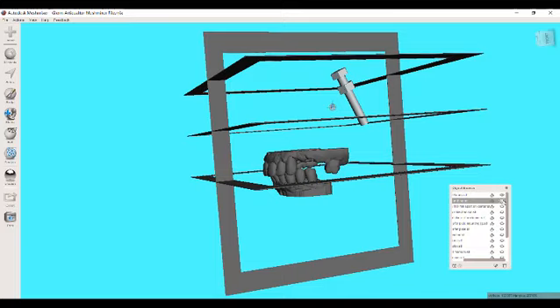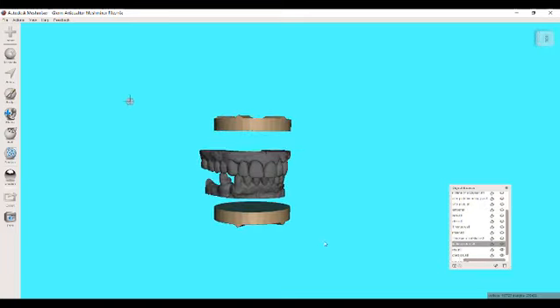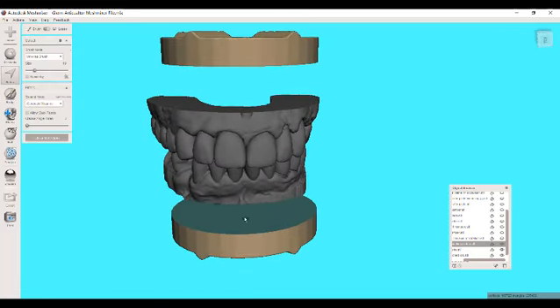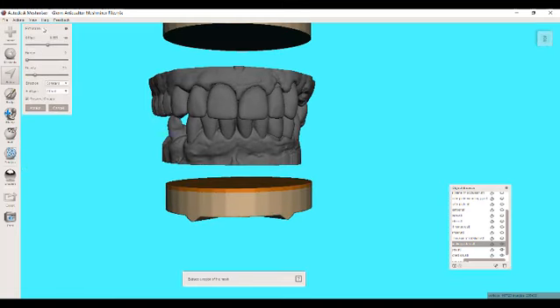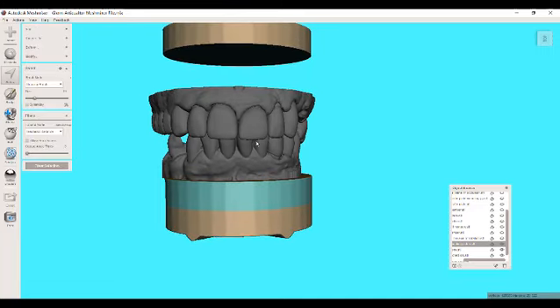So with that done, I'm just going to turn on the digital mounting plates. Let me find where I put those. Alright, so here are your plates, and one of the nice things about this Mesh Mixer file is that you've already got an individual face group for this portion. So watch what I do here. I'm just going to select that, and I'm going to hit D on the keyboard, or you could go up and hit extrude, but I'm just going to extrude this upward until it just touches that model. Alright, that looks good. I'll repeat for the upper.